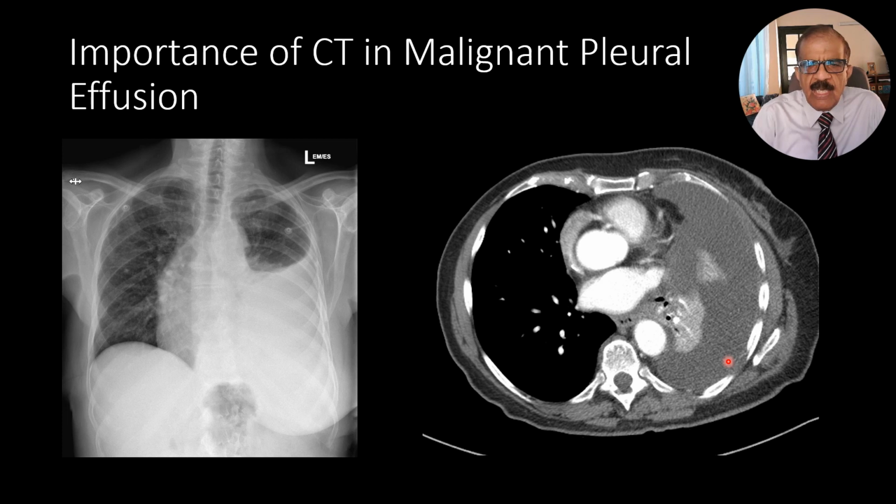So this patient has got pleural effusion with underlying lymphadenopathy. So that should give you the clue. Now of course this could be again tuberculosis or malignancy, but in some cases there could be just one big mass. Let me see if I can find an image with a large mass with pleural effusion.